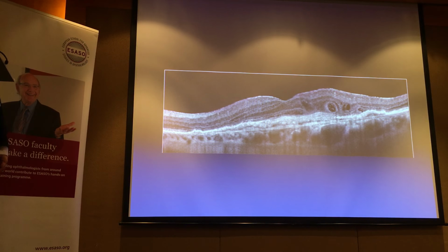How about this one? How about this one? Might be a cyst, right? So you see, but again, the intensity, well, in fact, this one has something inside even, but the fact is that they're not all the same. So be careful.